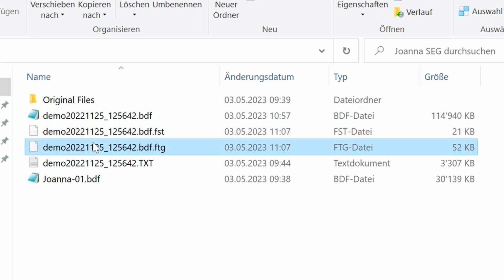These files were created by BESA. So normally what we would do is create another folder called EEG or NIRS analysis, Joanna, whatever. And then, because BESA creates a lot of files, because it never touches the original file, as you can see.